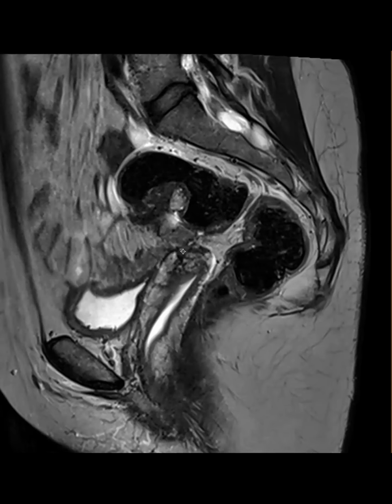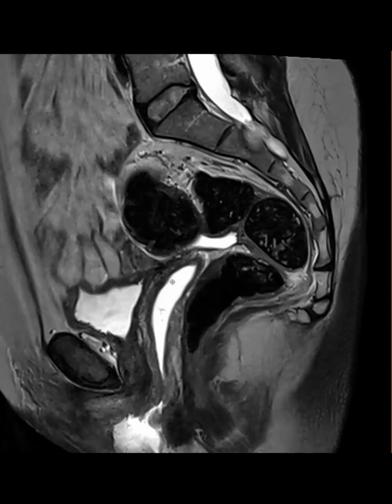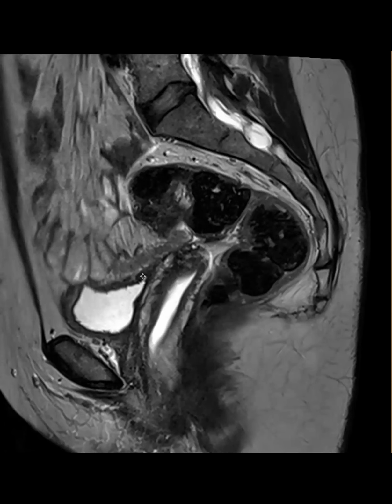For me, if there's distortion, then that has a high PPV, high yield. So I called a case, and maybe I'll find it, where there was DIE and the small bowel was right next to it. And so I called small bowel DIE, and surgically the small bowel was fine. So it was just right next to it without being involved. And in retrospect, there was no distortion or anything like that.